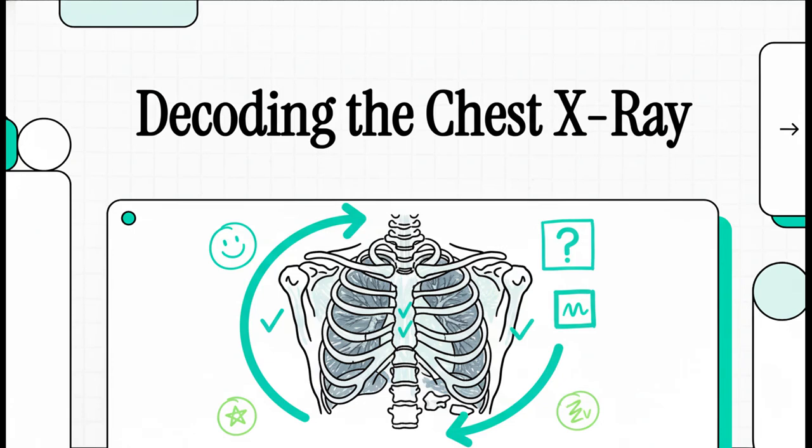All right, let's dive into one of the most common, but maybe one of the most intimidating images in all of medicine, the chest X-ray. I know, it looks like a bunch of black and white shadows, but I promise you, by the end of this, you're going to see it for what it really is, a story, just waiting for you to read it.